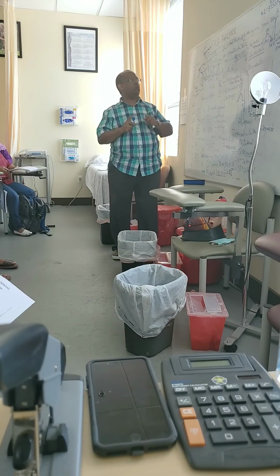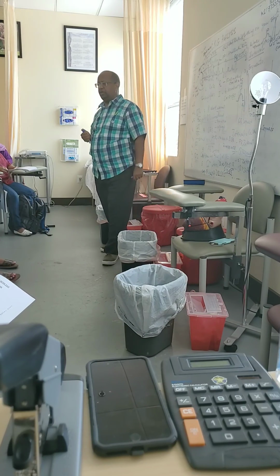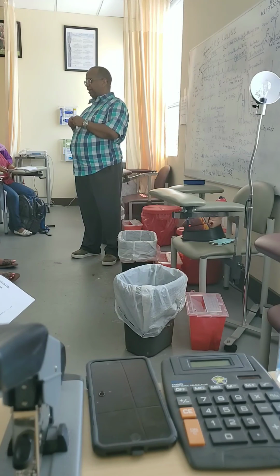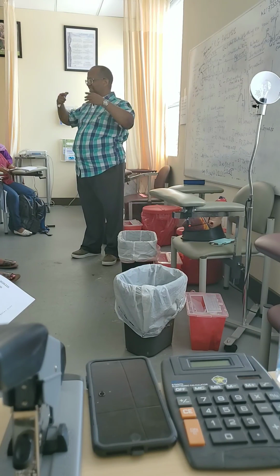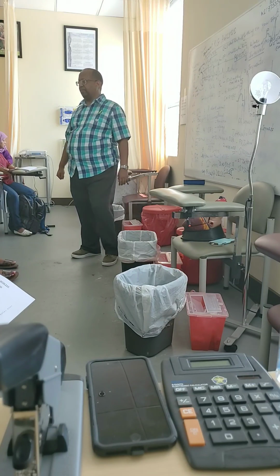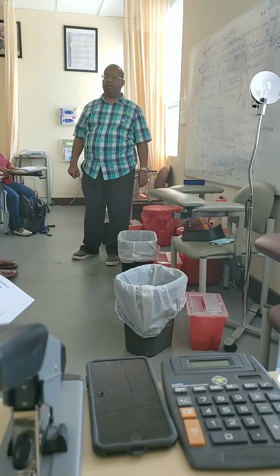Okay. So this is what we call EKG analysis in short. I think when you practice it, then you will really learn, because you are doing 10 EKGs. When you do more practice, you learn each time how to get that. Okay, thank you.